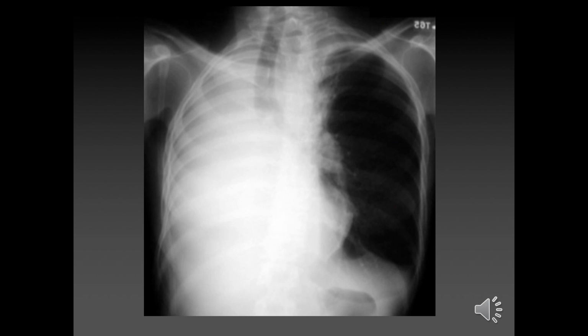And this is another one. Again, we can't see anything on this side. So any ideas what this might be? Is it being pushed or pulled? Hands up for push. Hands up for pulled. Hands up for not sure. Okay, fine. Just trying to make sure you're all listening. So this is a pull.